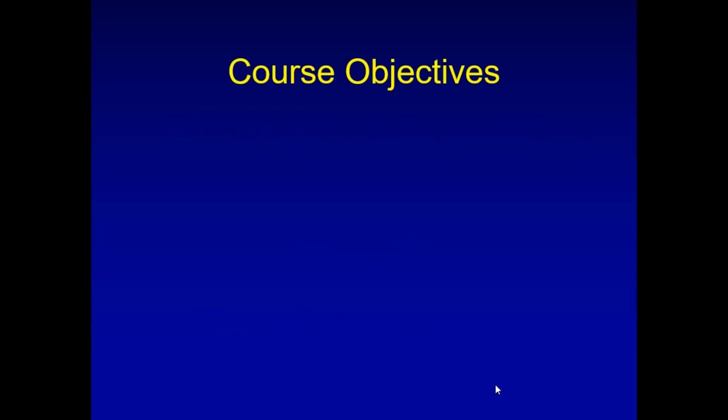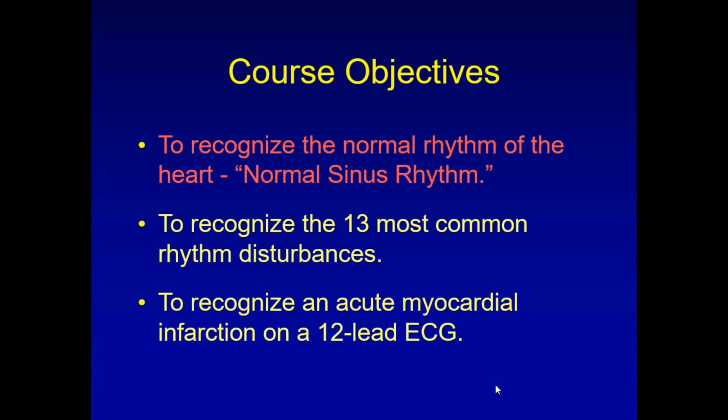Today our course objective is to recognize the normal rhythm of the heart. That is normal sinus rhythm, or simply sinus rhythm. We can't say a normal rhythm or a normal ECG. Sinus is the terminology for ECG.